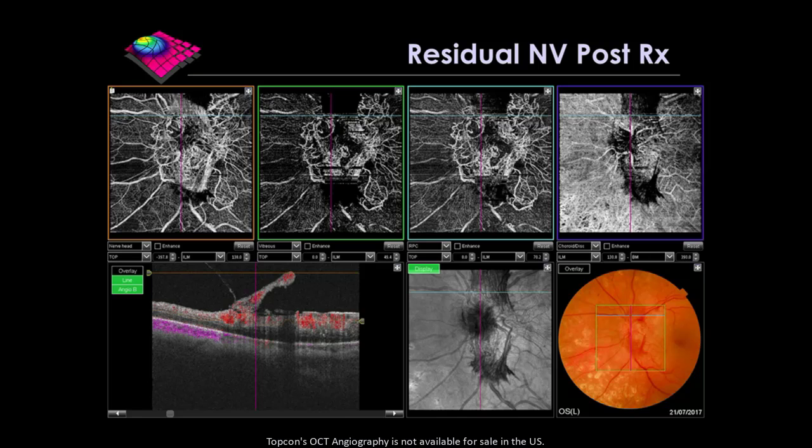Now, one of the problems as well is even in patients with good fixation, good quality, sometimes the neovascular tissue has a tractional element to it, and there's a very big distortion of the anatomy. Now, the problem is that sometimes the segmentation doesn't capture that exactly, and so that's also to re-emphasize why you need to look at the flow images superimposed on these. And I might have another cut here. So here's the cut here. This composite image is also really nice for looking at the neovascular tissue as well.